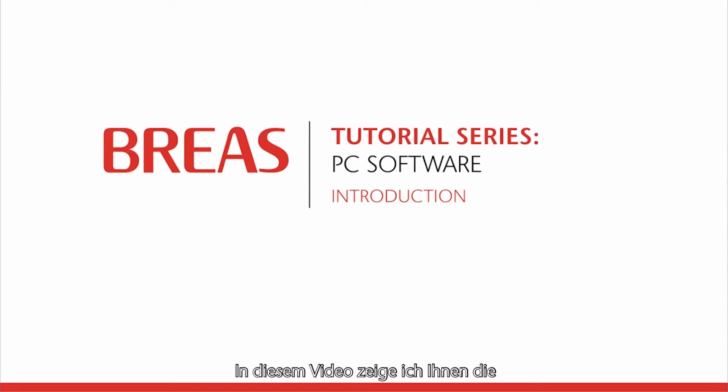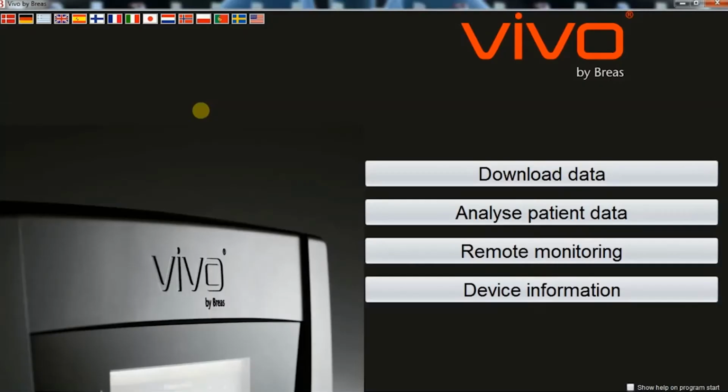In this video, I will show you the main features of the Vivo PC software. Each of these features will be explained in detail in the other movies that are part of this Breas PC software tutorial series. When you open the Vivo PC software, you will start from the home page and immediately notice the four main features of the software.